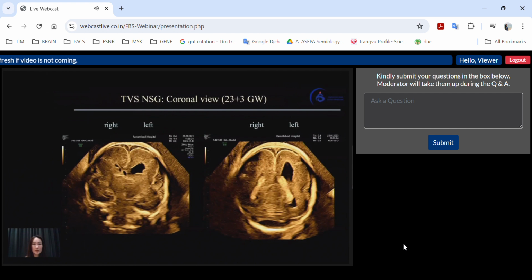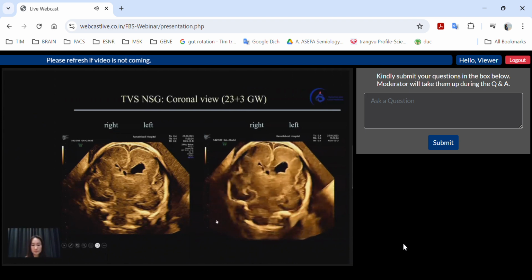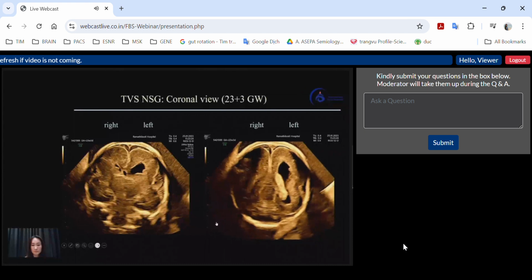The left image in the anterior coronal plane shows asymmetry. The left anterior horn is enlarged, square-shaped, and has an irregular lateral wall. The sylvian fissures are also asymmetrical, with the left side appearing shallower. The curve on the right scans from the anterior to posterior. Here we show an enlarged left lateral ventricle. You can see several scattered nodules along the frontal horns and body of the ventricles protruding inward.